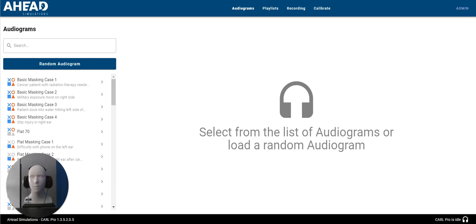I'm Rob from Ahead Simulations, but today you can see Carl is on camera. This is so that we can conduct a masked only audiogram for the Carl Pro unit. In other videos we went through unmasked and complete audiograms and walked through some other functionality of the software and to know about Carl. In this one we're really going to hone in on the skill of masking.